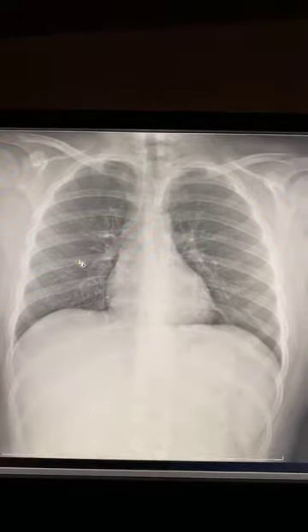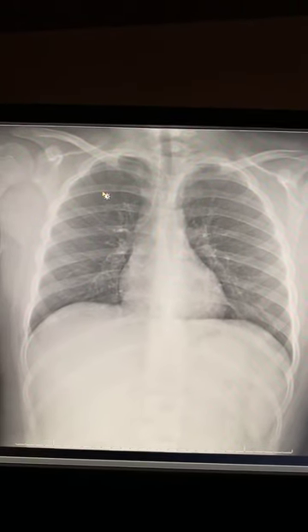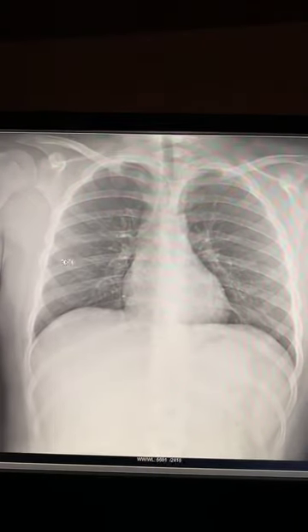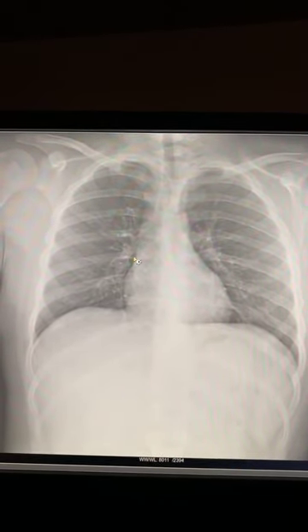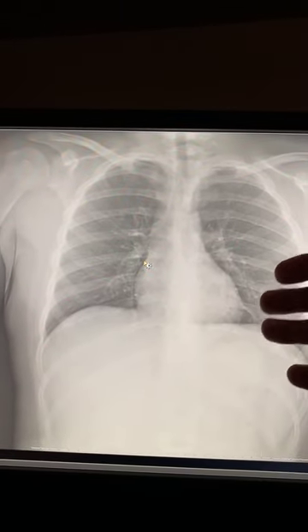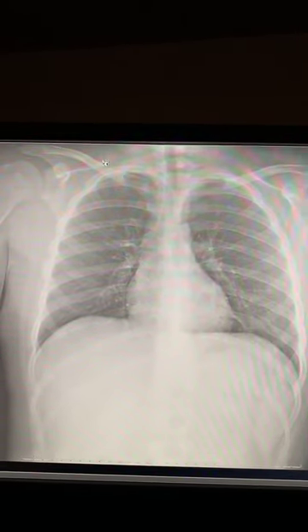So that one big thing that we were talking about before is a pneumothorax. So here we go. Remember, you're not just looking at it like this, you're windowing and zooming. Absolutely zoom. Not manually zoom. Don't shove your face to the front of the monitor and start looking for something. No, you're gonna window and then you're gonna zoom up and say, all right, where's that pneumothorax? Let me see. I don't see it there. Let me go to the side here.